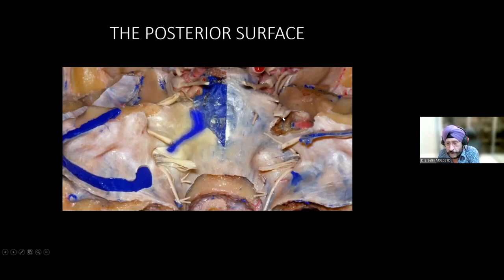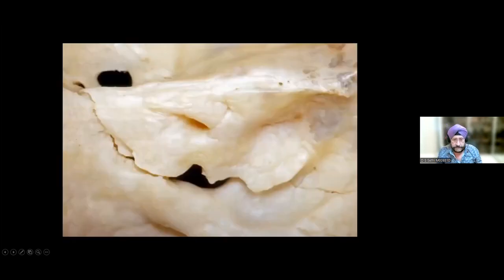And see, the contents of the petrous apex, rather, I would say, are the Meckel's cave, the petrous carotid artery, the petroclinoid ligament here. These are the landmarks, basically, in the petrous apex. Okay, and so let me go on to the next slide here.